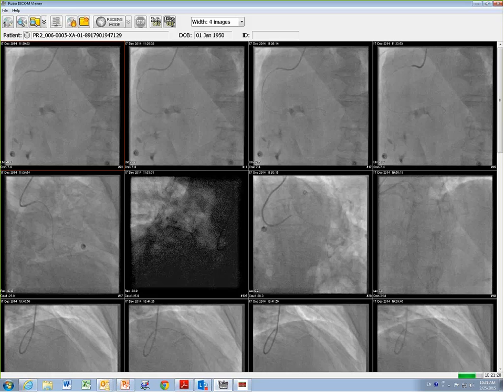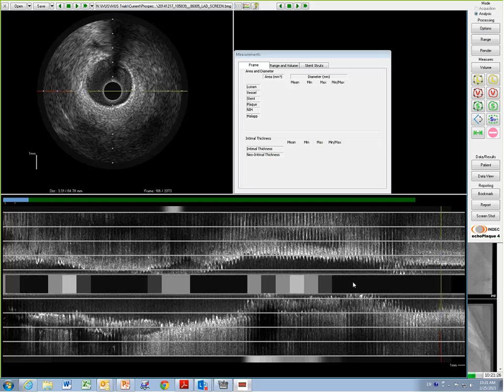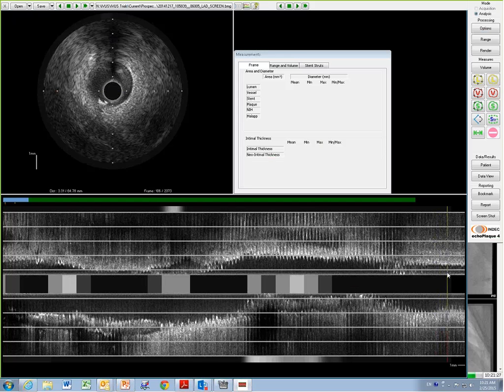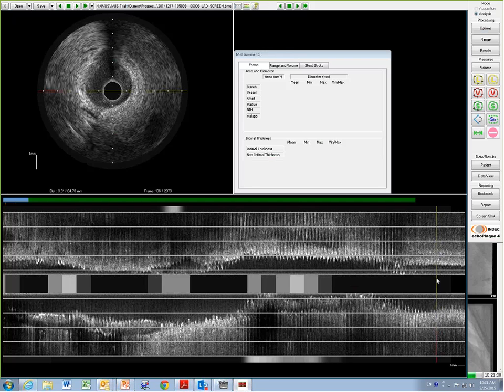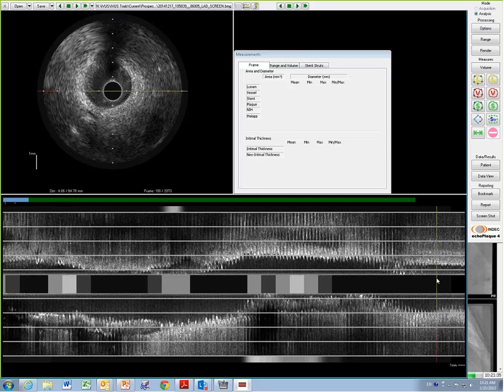The key, which I would explain to you today, is that the IVUS picture is sometimes not very easy to understand because of the quality, but I can see the hematoma here. So just understand that it's there during the procedure. It will help in the future with knowing that clearly. Yeah, I totally agree.